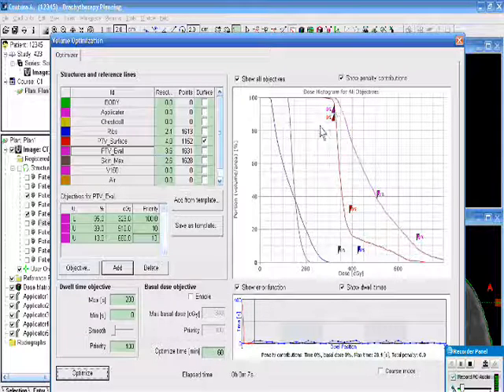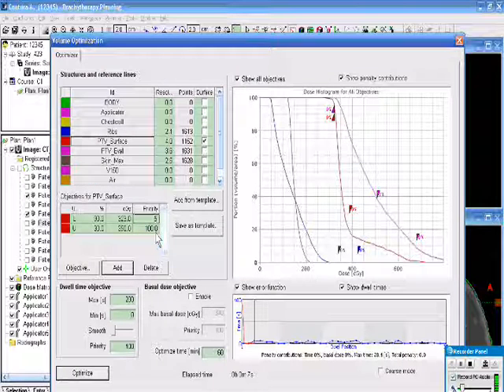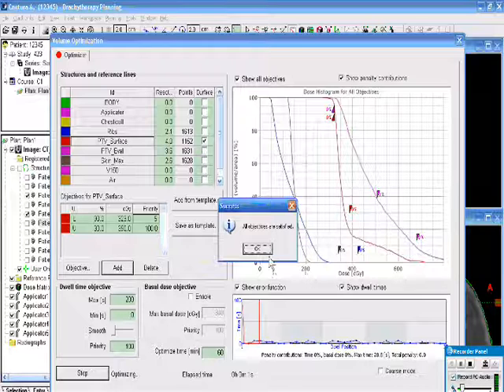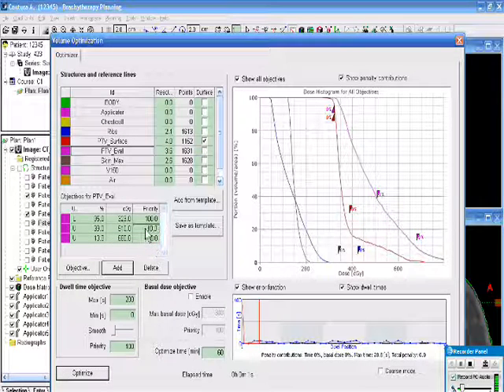So one way to do that is to take this surface, which is actually fairly useful in terms of the optimization, in spite of what some people think. And this lower one, I'll knock that way down, make that 5%, so that we will reduce some of this pull-up here and restart the optimization. It was too easy. Already we're still over-optimized here, so what I'm going to do is take this one, and I'm going to increase their weights to try and push that down. So that is on the PTV eval. I'll set this up to 100, and this one up to 100.